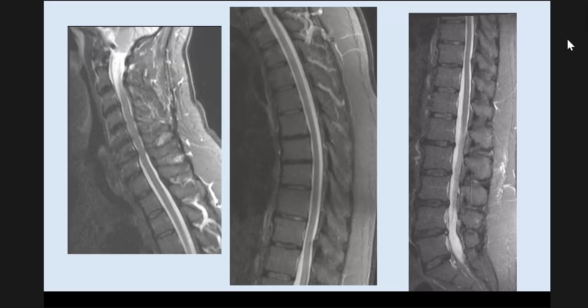The patient had MRI of the whole spine. These are some of the STIR images, and there was no abnormality detected. Checking on the chat box to see what people are saying about spinal imaging. Somebody has mentioned a collection. So basically, we are looking for collection within the spinal canal, and I don't see any. There's no spinal collection, at least in this patient. So, what would you do next? What is your strategy?